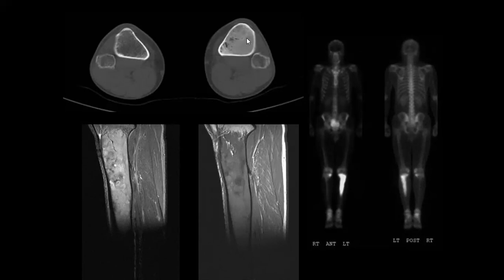Yes, especially with the ground glass appearance in CT, and in the MRI, you can see clearly the low signal appearance, and it's much trickier in bone scan because it takes high tracer uptake, yes. So we mention it in every place, that giant title in the exam that you should be careful, fibrous dysplasia. One of the good differentials, yes, lymphoma, nice, perfect. Lymphoma is a good differential in this case.